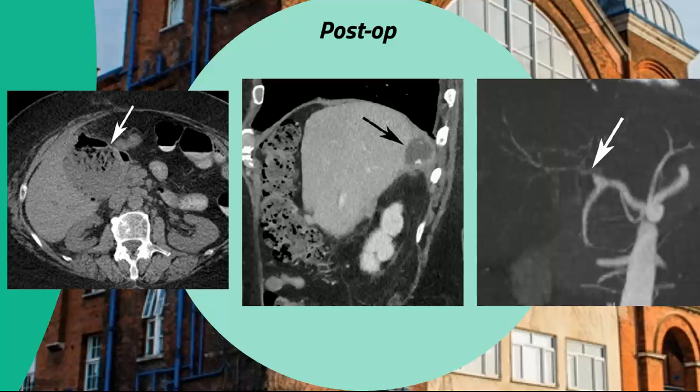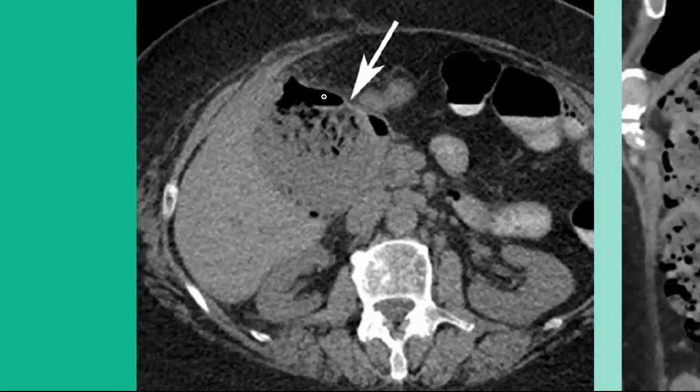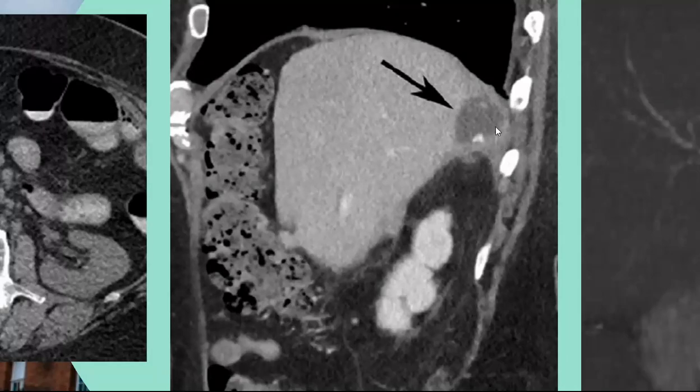Here we show a CT showing a large gas and fluid collection within the gallbladder bed post-cholecystectomy, consistent with an abscess. This is a sagittal CT of the liver. Behind the liver is this thick-walled, fluid-filled abscess, and within the abscess is a calcified gallstone, a dropped stone.